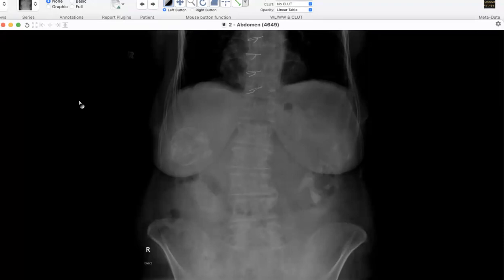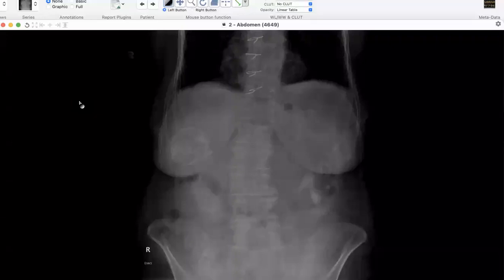Recent mammography was normal. Okay. So it could then be in the right hypochondrium, a well calcified lesion in an old lady. First to come to my mind is calcified hydatid cyst. I would like to know if she's an immigrant from an endemic area, so it could be hydatid. Yeah, she is actually an immigrant. So is that your only finding, or do you want to tell me something else that you're seeing on the X-ray?